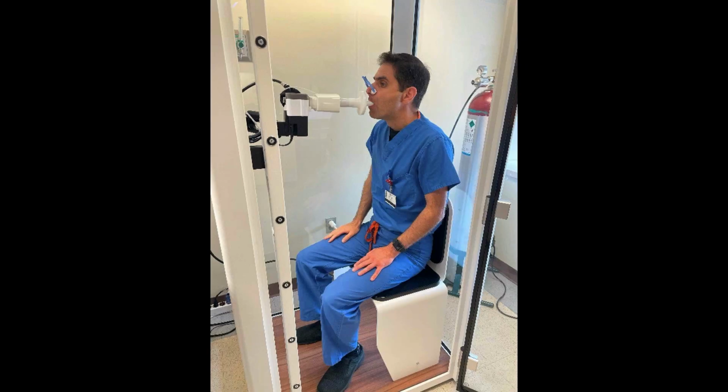Spirometry is required to make a formal diagnosis of COPD. It's the objective way of determining if airflow limitation is present and whether it's reversible. Airflow limitation that is irreversible or only partially reversible with bronchodilator treatment is the diagnostic feature of COPD.